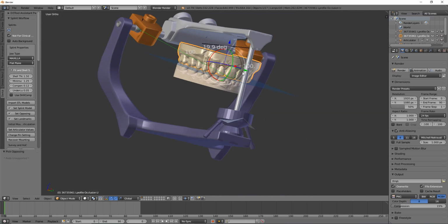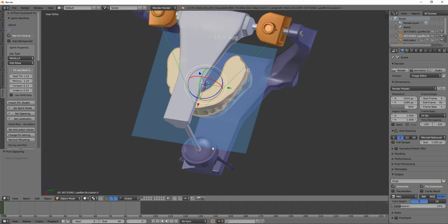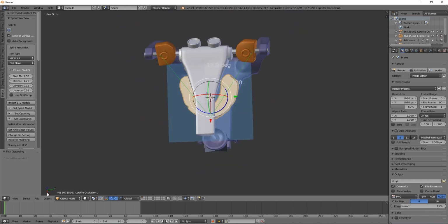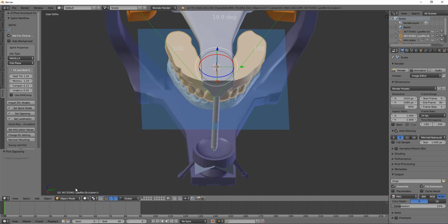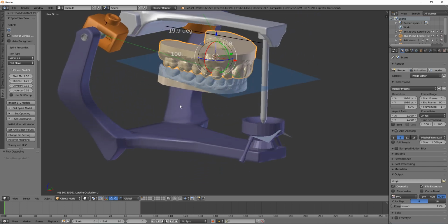And then the big thing here is in how the articulator is oriented, and also in the coordinate system. If you notice here that the x-axis is pointing forward, that was an arbitrary decision I made a few years ago, and now in the new version, we've changed that to match a big portion of other softwares. There's no convention out there, but we at least wanted to pick one of the main conventions, so we aligned ourselves with the DICOM format.